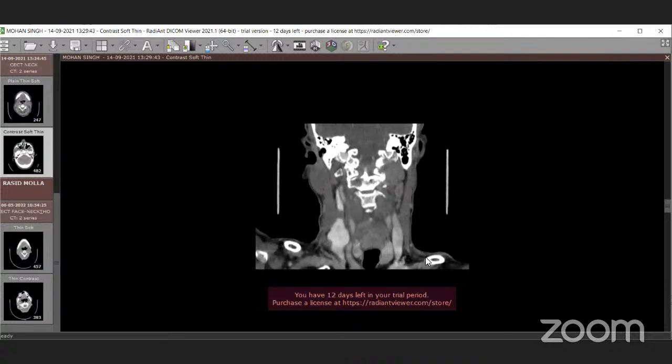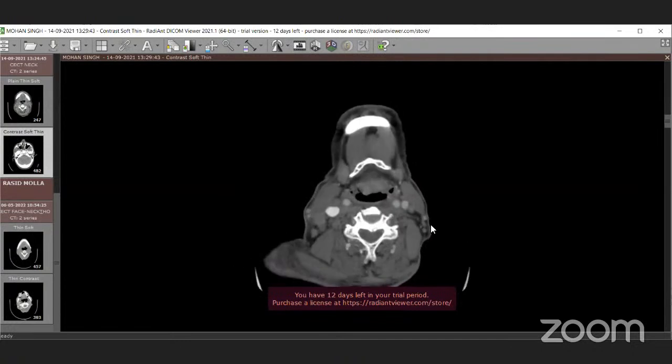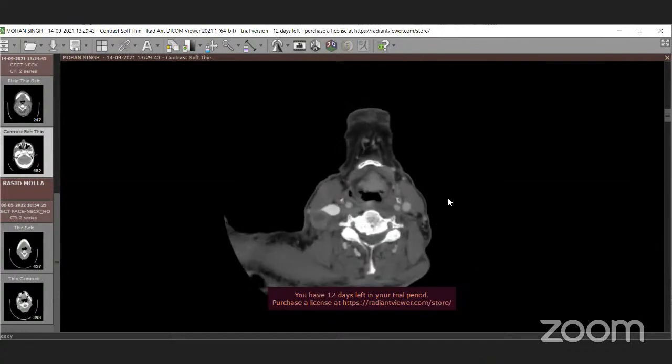Just one thing. We'll move to the transverse cervical vessels because it is very much important. Can you hear that? Hello. Transverse cervical, yes, I'm hearing. This is important because of the demarcation of the level 5 lymph nodes.